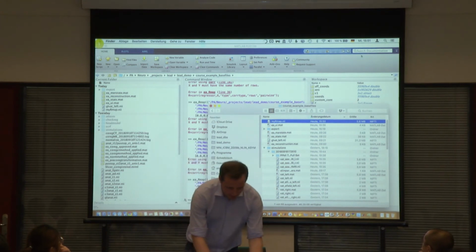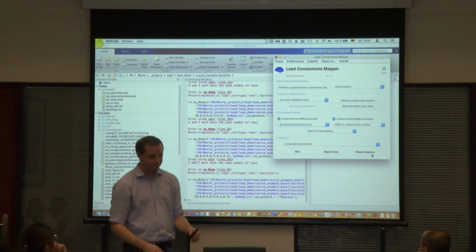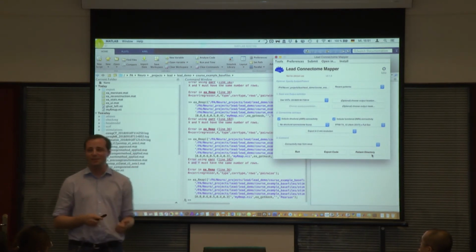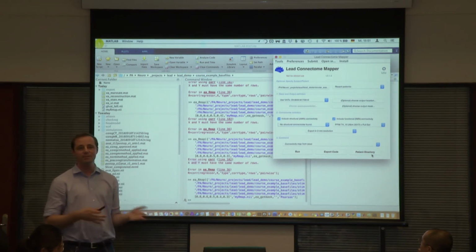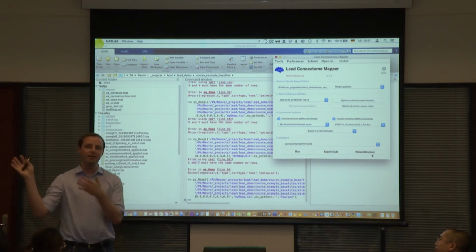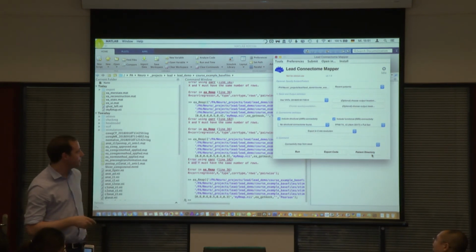Okay, so I guess key thought here is a few things. So first of all, Lead Mapper is a tool more or less mainly for normative connectomics, but you can also use patient-specific data if you have it. And it gives you nifty files. You can then use these with any other tool you have, like SPM or FSL or so.